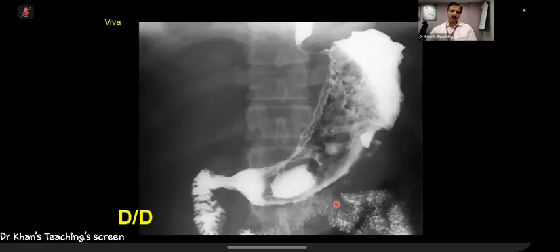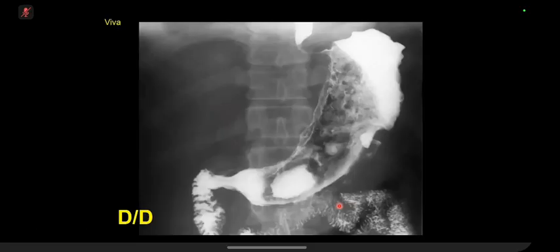Are you happy with this appearance of the stomach? No, so the mucosa is grossly abnormal and the stomach does not distend as much as I would expect for this amount of contrast administration. So I think that there is evidence of generalized luminal infiltration with large target lesions. My number 1 differential is lymphoma, but other malignant infiltrations would be included.